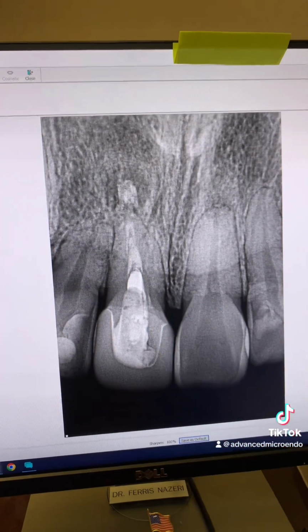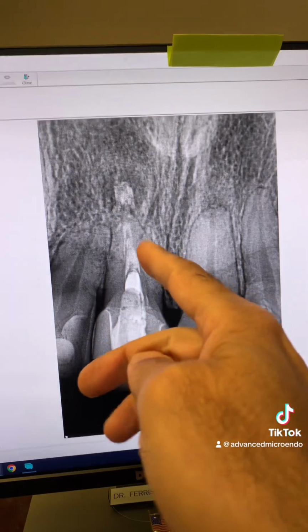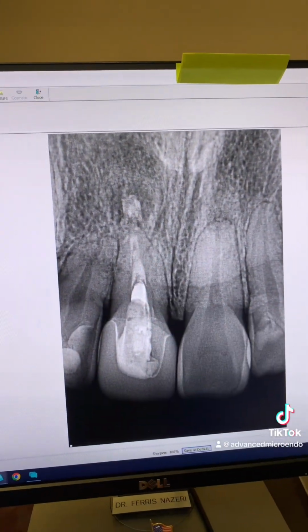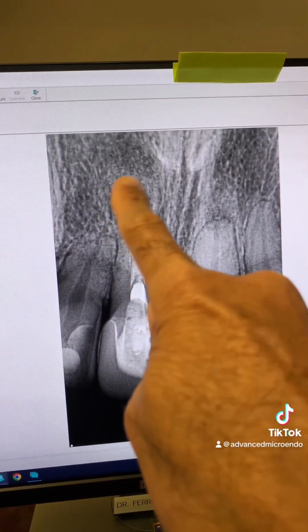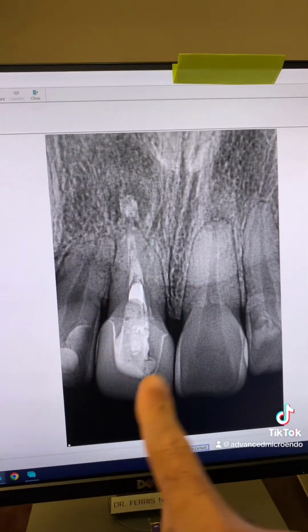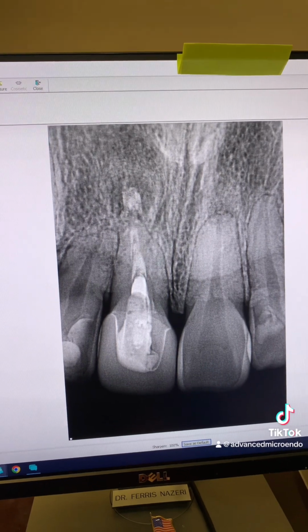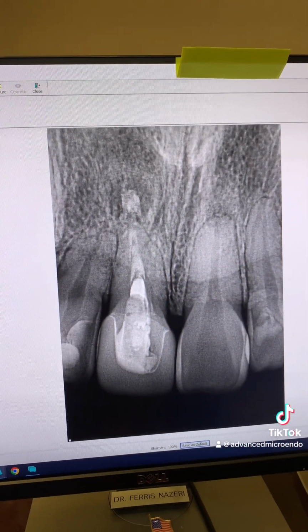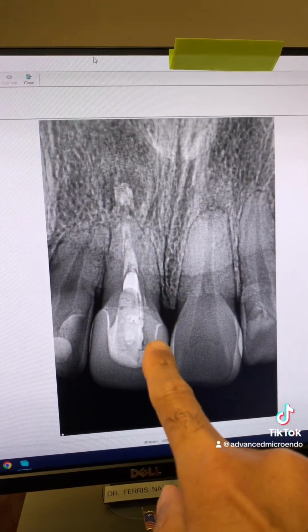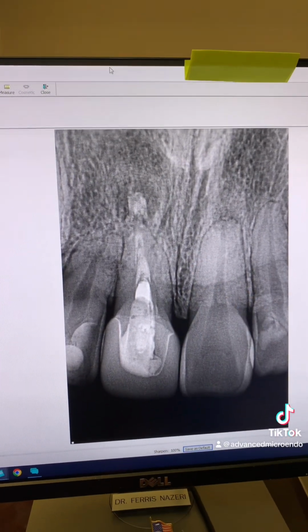And this was today. 1 year post-op of tooth number 8. What happened to that huge periapical radiolucency? Almost completely healed. Did MTA extrusion have any negative effect on the outcome? Nope. Patient has a brand new crown on the tooth and looks fantastic. And let me put them next to each other so you can see what we accomplished. By the way, we redid the root canal in one appointment. So it was a one appointment endodontic retreatment.